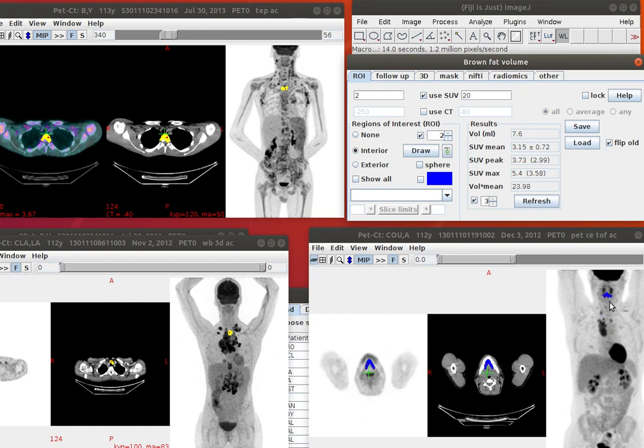Obviously, it's totally not even close to the same organ, but the idea is when you're changing which organ you want to look at, in that case you want to turn the tracking back on. And when you're looking within the organ, then you turn the tracking off, and you can click back and forth without changing any points. Okay, and this is essentially what I wanted to show.